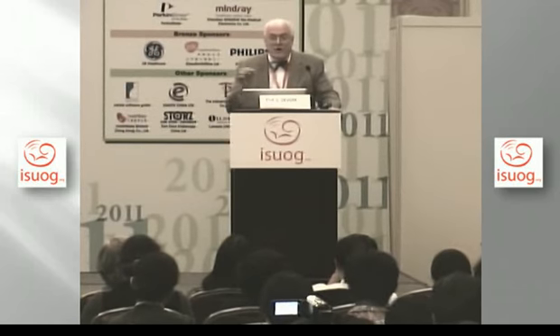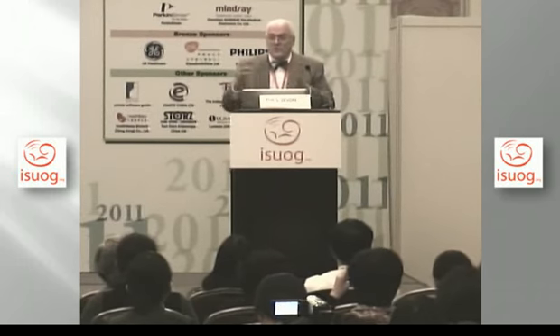Okay? So what I would suggest, if you happen to have a machine that has this on it, learn how to use it. Even on normal fetuses. Learn how to use it, so when the time comes, when you have an issue, you know what tools to use to build your house, so to speak, or to fix your car. You know how to do that. Same tools for looking at the heart.